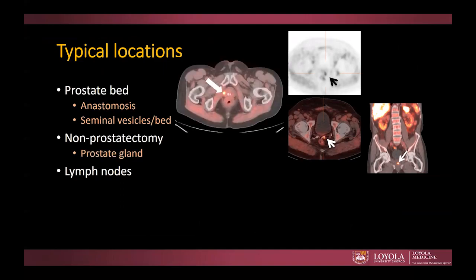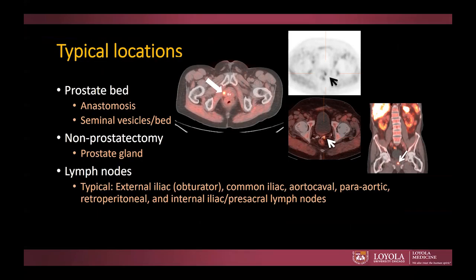And then for a patient that had no prostatectomy, this is one of the examples that I showed before. Concept of lymph nodes, very important to know that for the exam. You want to look for an inside-out pattern. The most typical uptake will be within the pelvis, goes up into the abdomen, and then outside into the external pelvis, meaning into the inguinal area or into the chest.